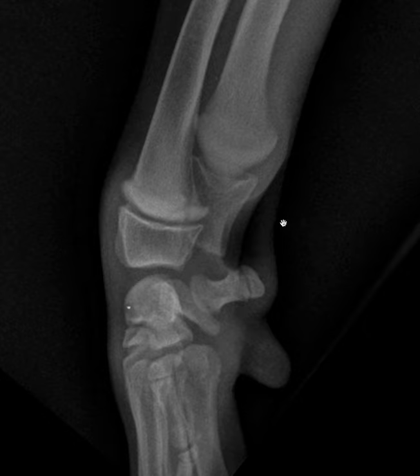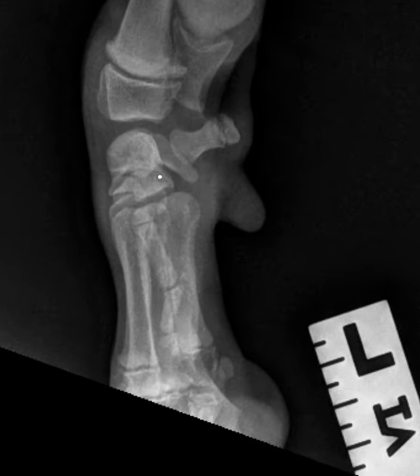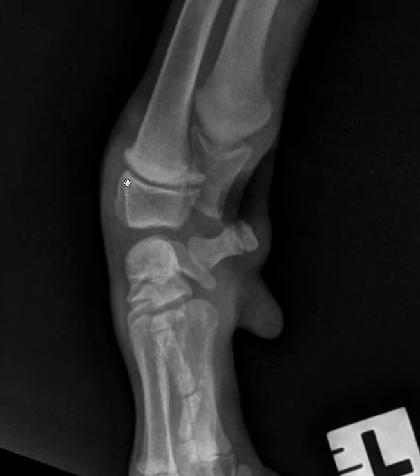The last thing that I look at, and this kind of plays into opacity or disruption, is margination. So the margination of the physis should be quite sharp, and when you start to see any irregularity, and I don't really see much of that here, or at least not enough that it would cause me to feel concerned, pop to the other one so we can look at it too. The margination you can see is fairly distinct.